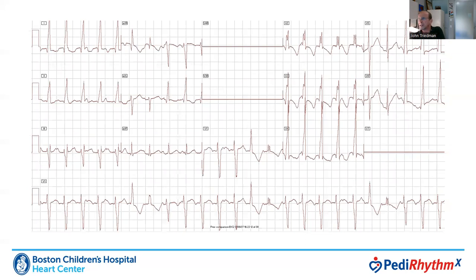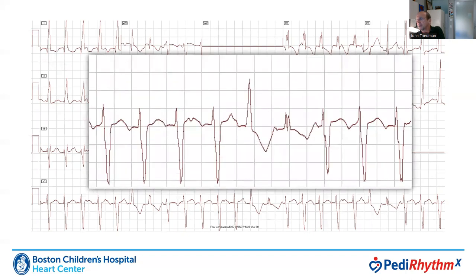How do we know it's ventricular tachycardia and not just a wide complex junctional tachycardia of the type we saw before? Well, you remember when we had sinus capture of JET, as I showed you before, the early beat came with the same morphology as the sustained tachycardia. In this case, we can infer that there's VA dissociation, and here we have a capture beat. And the capture beat is narrow. It has basically the same shape as sinus. The next beat, also partially a capture beat, we'll call that a fusion beat. And then we go back to a ventricular beat with quite a different morphology. So we can say with 100% certainty here that this is not junctional tachycardia with aberration. This is, in fact, ventricular tachycardia.